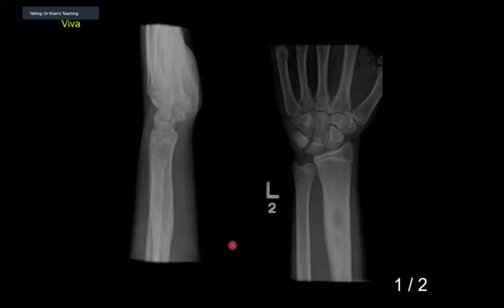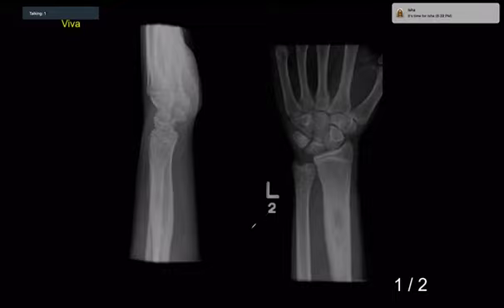So what else? Which further malignancy? Osteosarcoma tends to involve the metaphysis more. Ewing sarcoma, possibly, but again, less likely. And why do you say less likely? It just has a more typical appearance of an abscess to me. It's very central. There's no cortical or periosteal reaction. There's increased bone sclerosis. Look at the lateral. Do you see any periosteal reaction there?